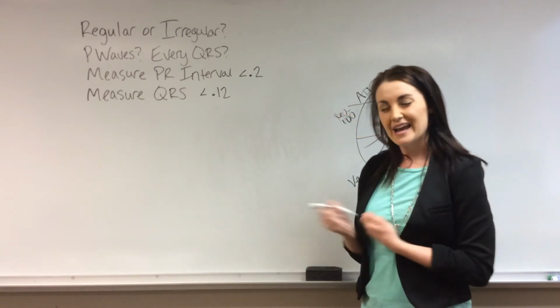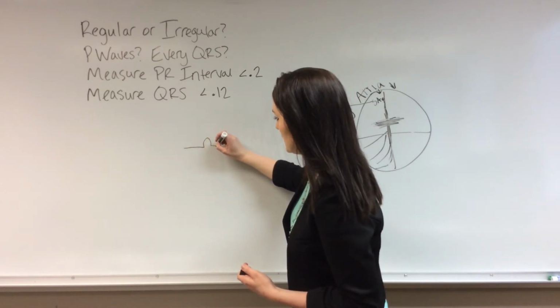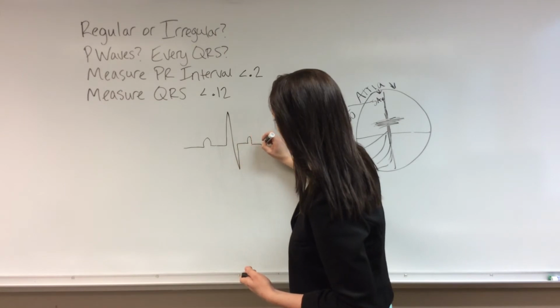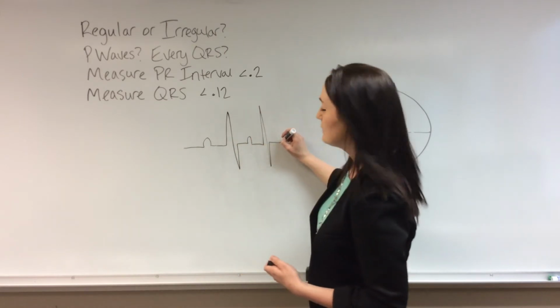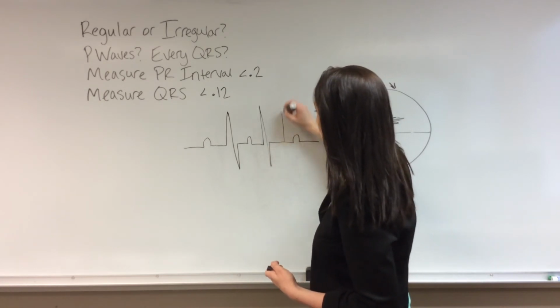which is also kind of hard to draw, in that your P waves... I'm trying to make it look a little bit more haphazard than it is.